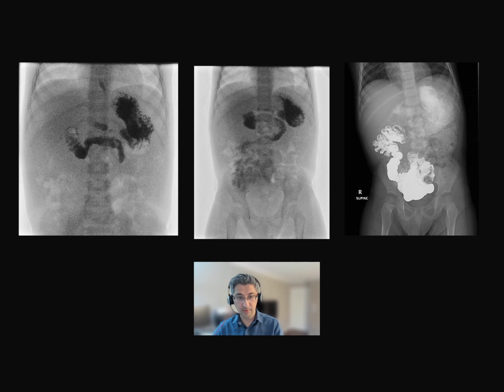Although the duodenum is crossing the midline, the D3, the DJ junction is slightly below the level of the pylorus. And I wasn't sure, so I followed the patient to get a final image to show the TI junction. The TI is on the right side of the abdomen, but a little bit high. So there is most likely some incomplete fixation here. I wasn't sure. I described my findings. I said this is suspicious for malrotation.